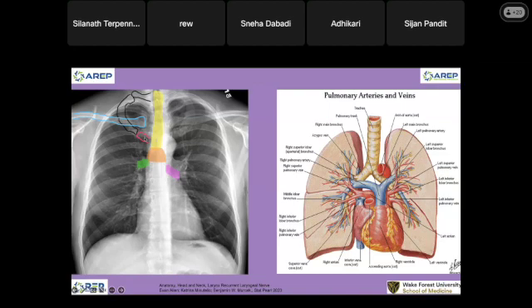You don't see the cartilage because it does not have density. It's so loose and you can't see it. If that cartilage calcifies, you will see it. This is the pulmonary artery coming out from the right ventricle and going to the lung. This is my scapula tip here. The spine is right here, this is my vertebral body, the T-spine. Here is the right main pulmonary artery, and the left main pulmonary artery here. After gas exchange, it becomes oxygenated blood. Look at this little cute thing here, which will come back into the pulmonary vein.